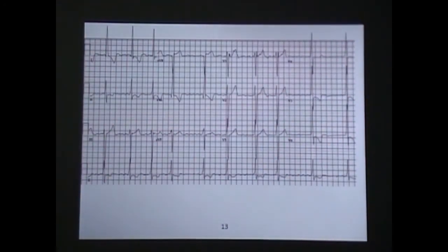How about this one? It's irregular, it's AFib. Depression issues, looks like lateral. So do we see P waves with every QRS? Almost looks like a flutter, but not consistent enough, though I can see it's irregular. I don't have P waves with every QRS. There's a bunch of stuff going on here. My QRS complex is not wide.